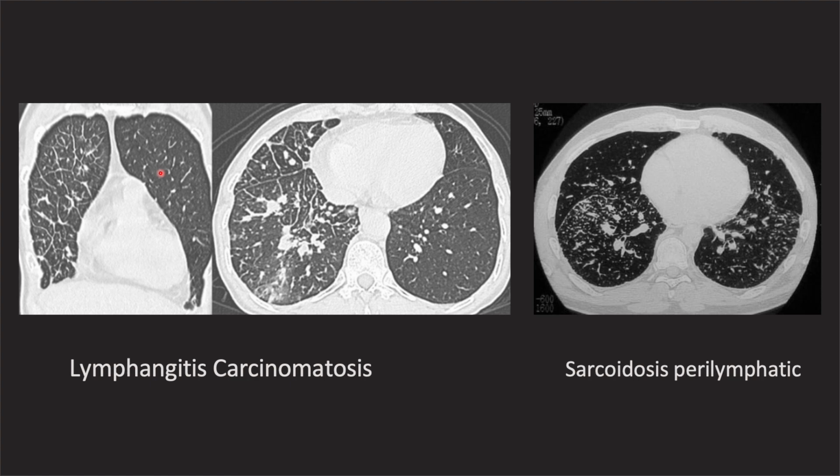And exceptionally, sometimes because of hematogenous spread, you may see them all through the lung, or in a centrilobular configuration. But here, the sarcoid nodules are more restricted to a pattern, to an area in the lung. They will be along the lymphatics, but those nodules which are because of other differentials may be smaller, they may be micronodules, or they may be dispersed anywhere and everywhere, as against sarcoid.